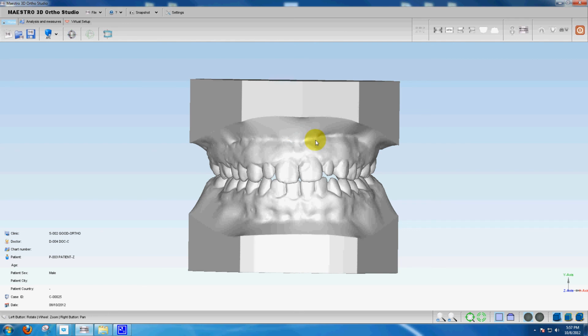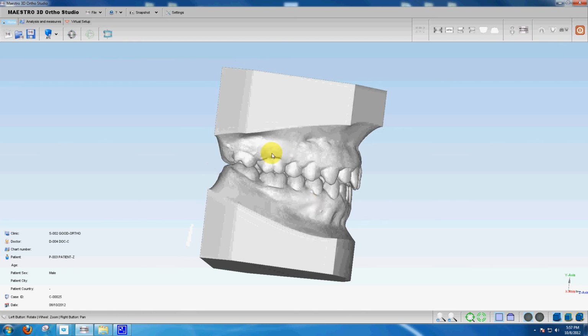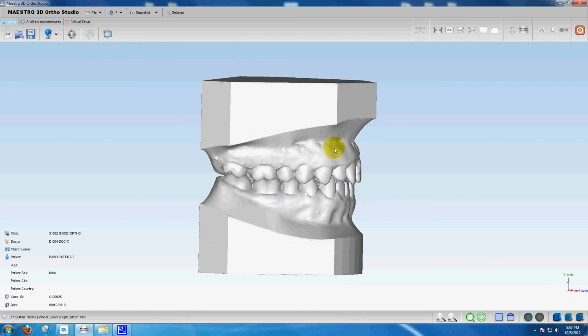into. Now, it is very common for some scans coming off of the intraoral scanner to be initially presented very significantly out of proper orientation as far as local origo is concerned. And I'm going to show you an example of that in the next tutorial.